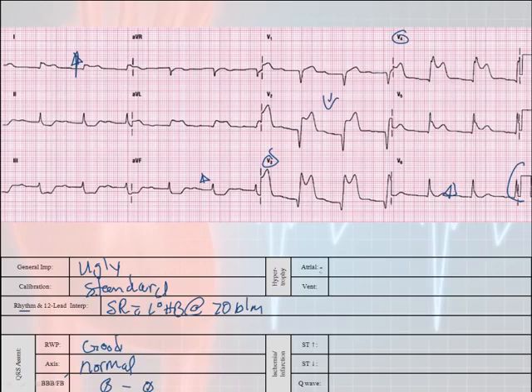Now let's look at my atrial enlargement. Do I have any atrial enlargement? As I look over here in 1 and/or 2 and/or 3, it doesn't look like I have any humping or any peaking. So I'm going to say no atrial enlargement. Ventricular hypertrophies, I would have to count these, but I'm going to say that there is none for the precordial leads. And if you remember, AVL, 1 and AVF need to be 11 millimeters of R wave, or 12 millimeters of R wave, or 20 millimeters of R wave, and I don't see that anywhere. So I'm going to say that there's no ventricular hypertrophies at all.